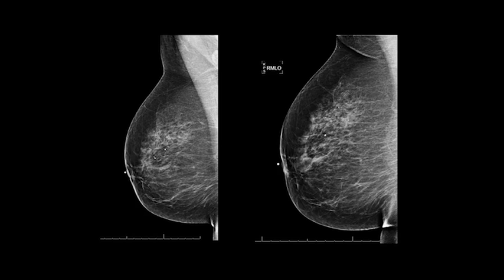But that's the difference between a small paddle and a large paddle because the patient maybe doesn't have a large breast. And you're like, well, I really don't need to use a large paddle because the patient doesn't have that larger breast. Well, they can get elongated when it goes to the MLO. The breast can really get very long, and therefore they're going to cut the bottom of the breast.